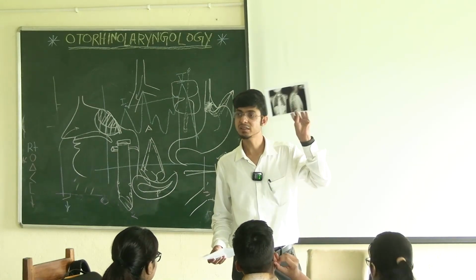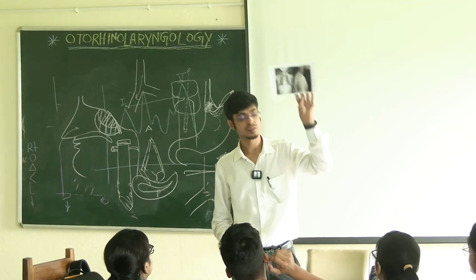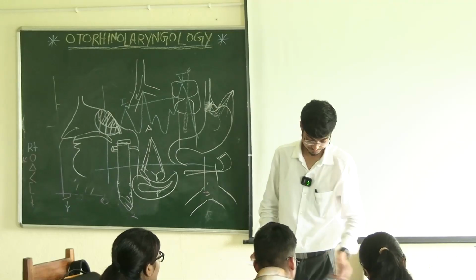It's the same x-ray again. Where, esophagus or bronchus? Esophagus. Very good.